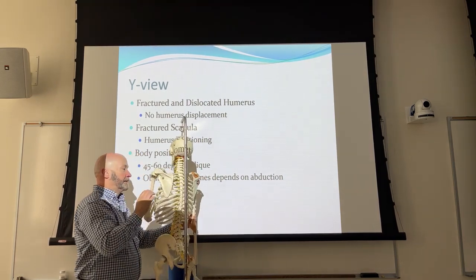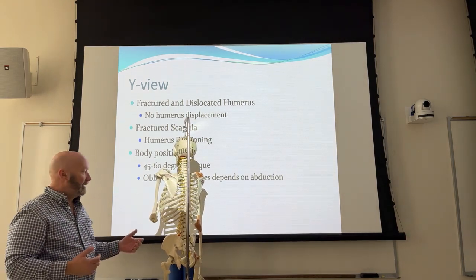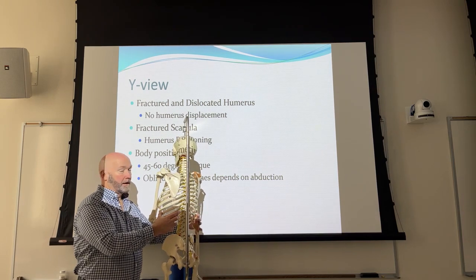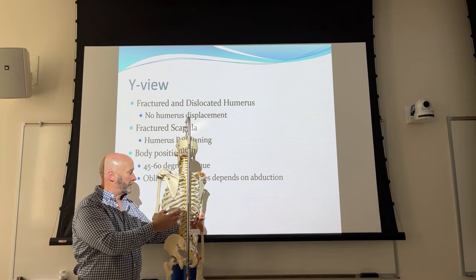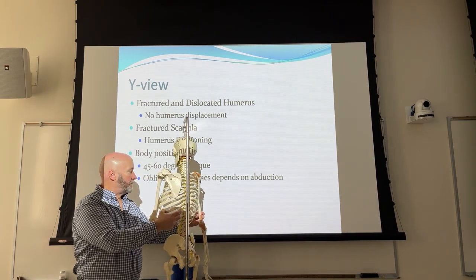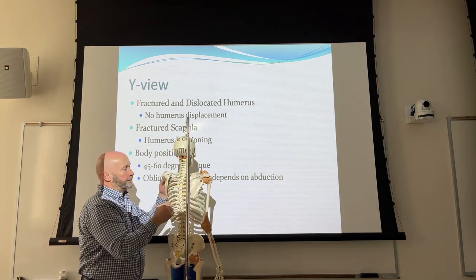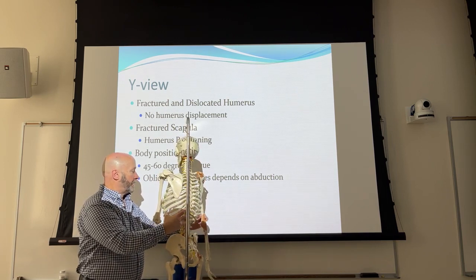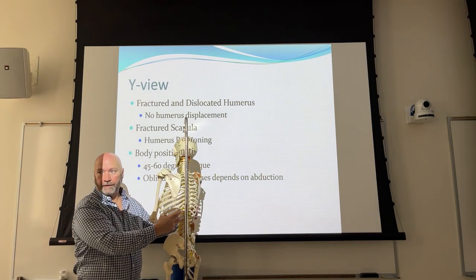Keep in mind that there's a lot of positional pain with shoulder injuries, and if the patient has a potentially broken scapula, it's going to hurt a lot, but look how little you actually have to move the humerus in order to see it. It's not a whole lot, right? So get it out of the way, whichever way is easier for the patient. Because of the construction of this thing, it doesn't want to go posteriorly, but it can go in either direction. It doesn't really matter. Just get it off of the body of the scapula.